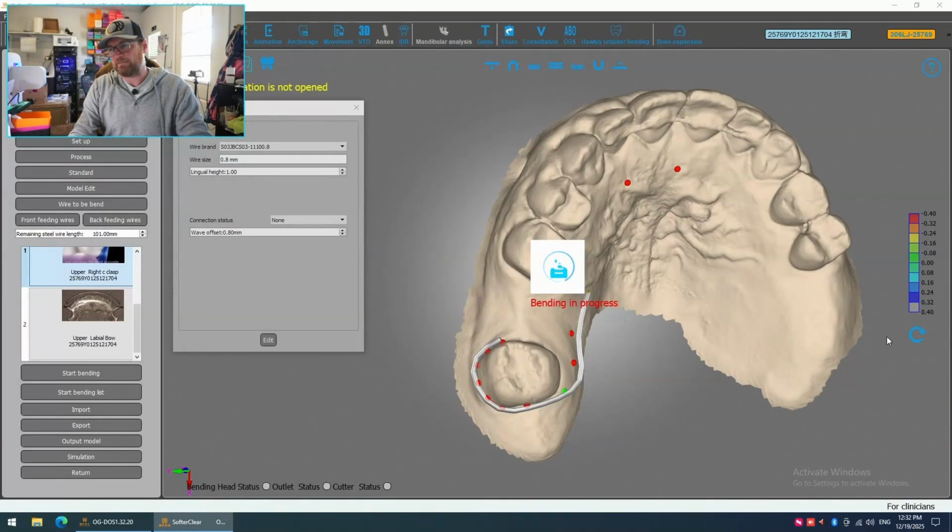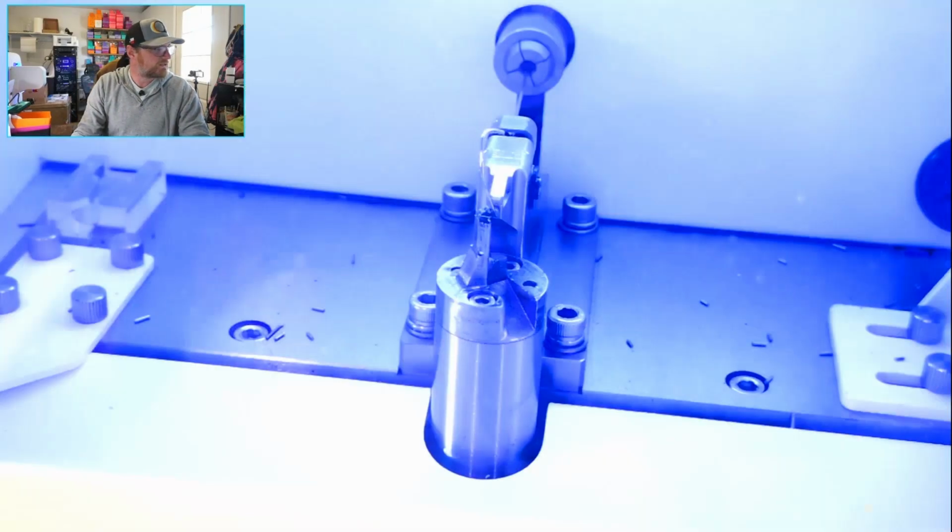Okay, I messed that up. That's my bad. I was trying to turn the light on so that we can see the result, and then I messed up the result. Is it still stuck there?